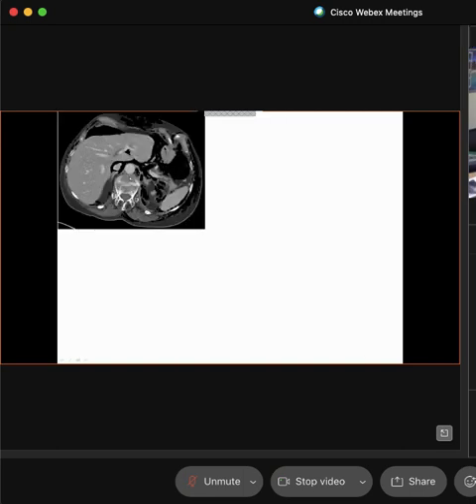Okay? So taking a look at this, this is an abdominal axial projection. This object right here, Jolie, what is it? Here's the vertebrae. Is it the liver? It is the liver. So this is the right side. We know that this is the patient's right side. And we see a lot of liver, don't we? And we could go back, and I'm not going to ask you to label the spleen, but there it is.